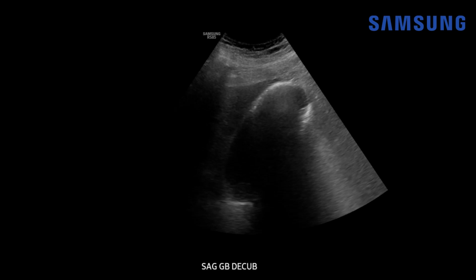So let's look at the last case. This is a 7-year-old male who presented with clinical findings of cholangitis and also had significant bilirubinemia and elevated AST and ALT levels. So already this is beyond just a typical cholecystitis. Here we're looking at a sagittal view of the gallbladder. Here's the adjacent liver. We can see that the gallbladder is distended. But then notably, we also see these curvilinear echogenic areas, these bright reflectors that appear to be in the wall at the level of the fundus.